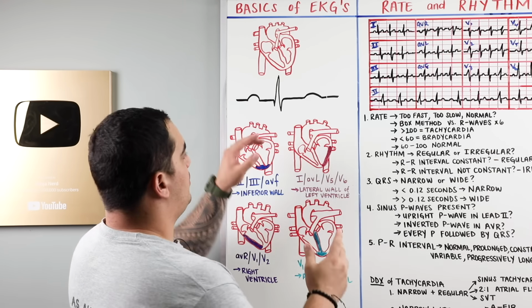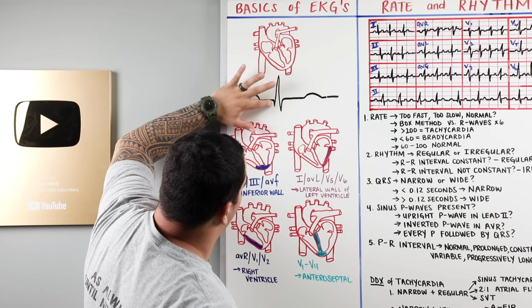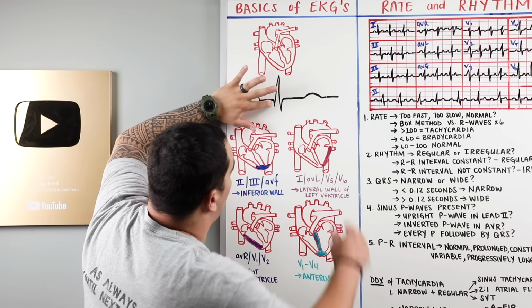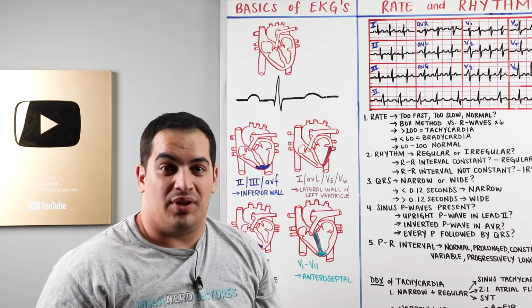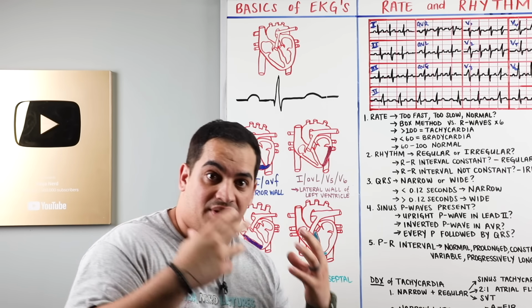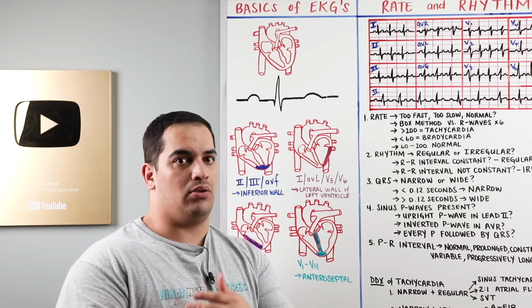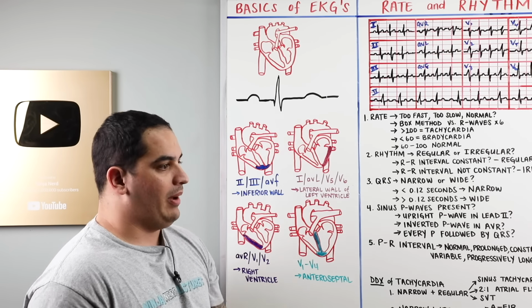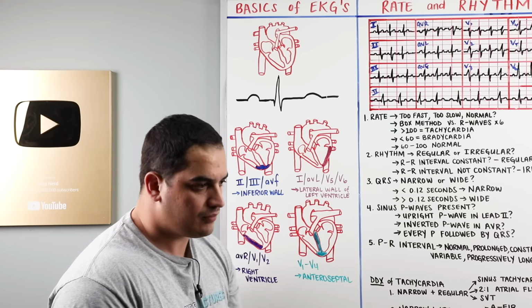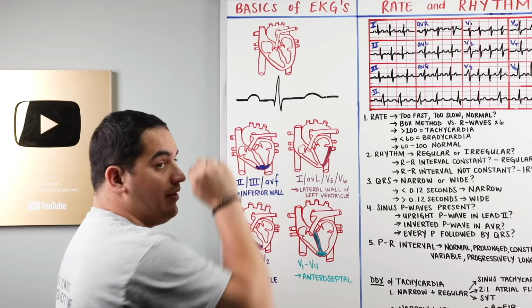The last part of this EKG that I want us to talk about is what's called the QT interval. So the QT interval, it starts right here, right before you have that Q wave, right? So just as we get ready to go at that downward deflection, all the way until after the T wave. That is the QT interval. It's indicative of the time period where the ventricles are depolarized and repolarized. Very important later when we talk about prolonged QT intervals, okay? So I think that gives us a big idea about the different components of an EKG, particularly the waveform, and what that tells us about the electrical activity of the heart.